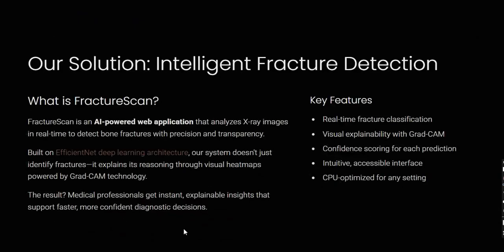Now, the solution that we have provided to address this challenge: we developed FractureScan, a web-based AI application that analyzes X-ray images in real time to detect bone fractures. The system uses an EfficientNet deep learning model combined with Grad-CAM to visually highlight the fracture affected regions, ensuring transparency and building clinician trust.